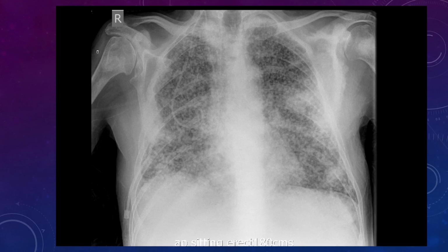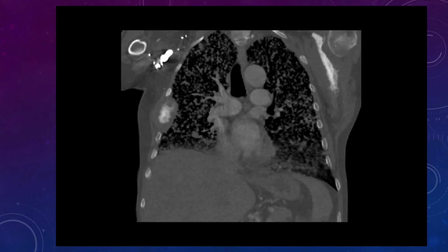So now you start thinking about the ribs again. Can I clearly see this rib? I can't, can I? I can't make out that rib at all. I can probably make out this one, probably here. At a CT chest, we've got this destructive rib lesion. These are multiple miliary metastases, most probably throughout the lung fields, and we've got skeletal metastases.